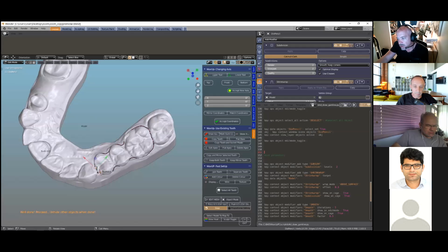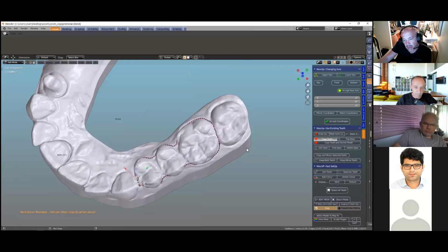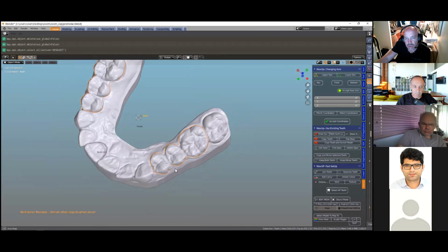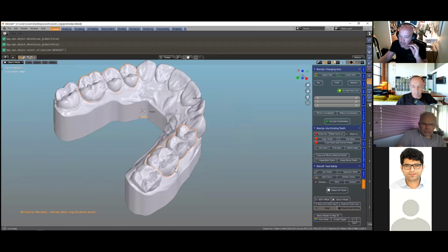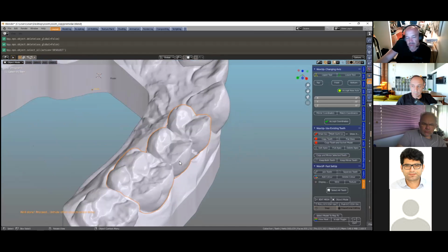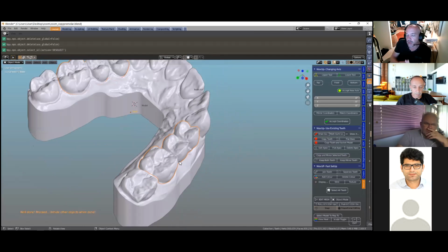And what I'm going to do is we're going to copy, and then we get a chance to then mirror image that copy and mirror selected. And that puts it straight away to the other side. Now this is very helpful because if you wanted to make a temporary bridge, for example, and this is not a crown and bridgework module, but the opportunity exists.